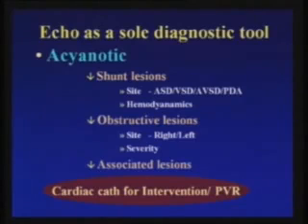We can see the shunt at the level of the atrial septum, whether it is an ASD fossa ovalis, ostium primum, sinus venosus, SVC or IVC type, or the coronary sinus type. So what type of defect we will be able to define by the echocardiography, and then the direction of shunt and the PA pressure, the rest of the issues.